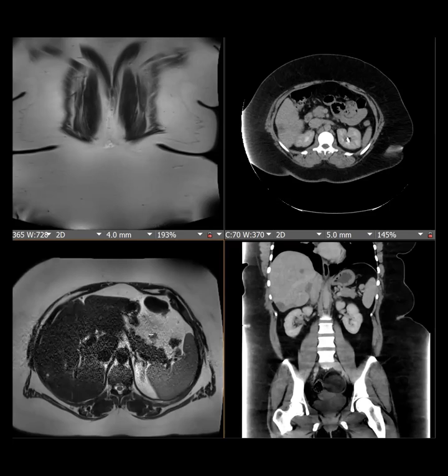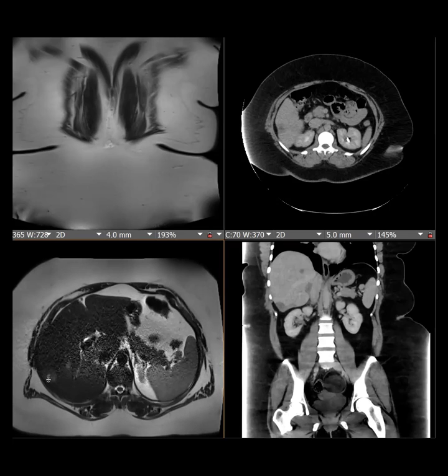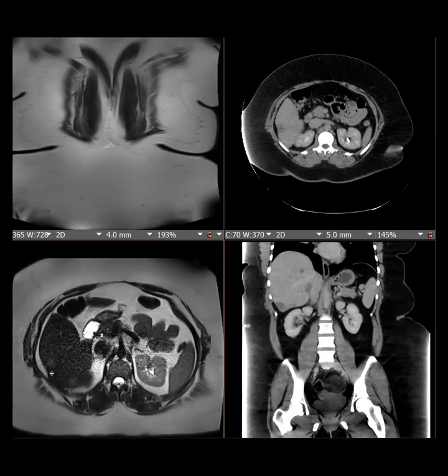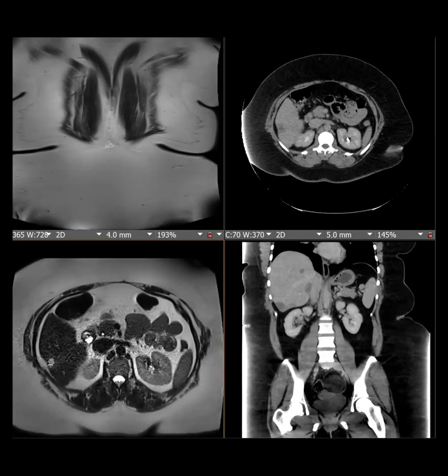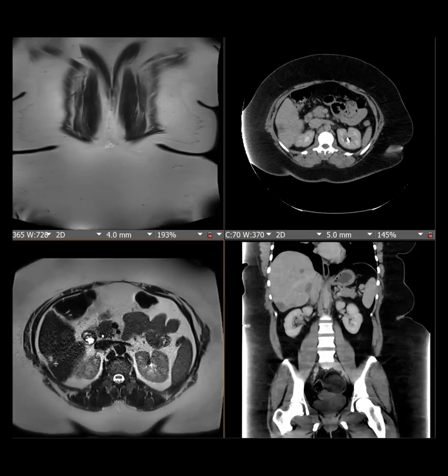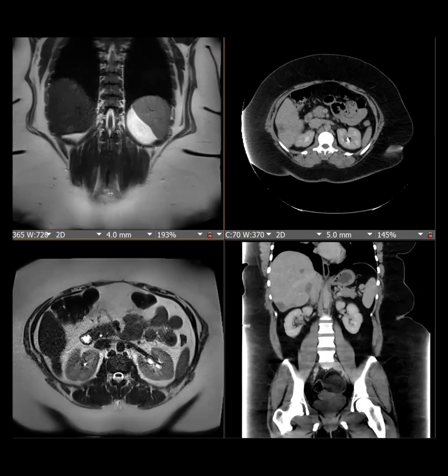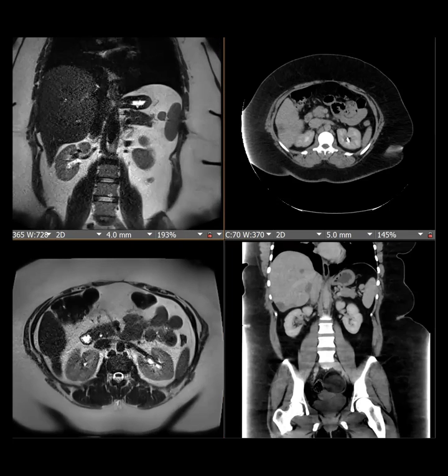Specifically, I want to bring your attention to these peripheral subcapsular lesions that have a little bit of retraction. Yes. Wow. Correct. It's classic. This was a good case, so I wanted to share it with the group.